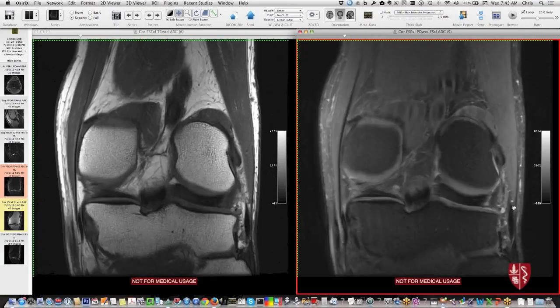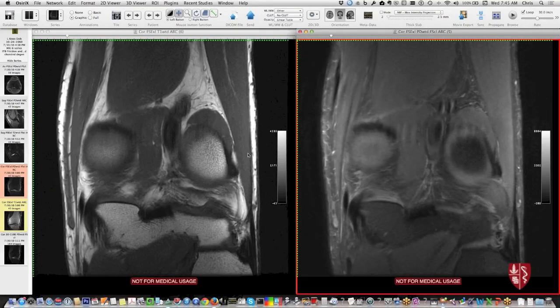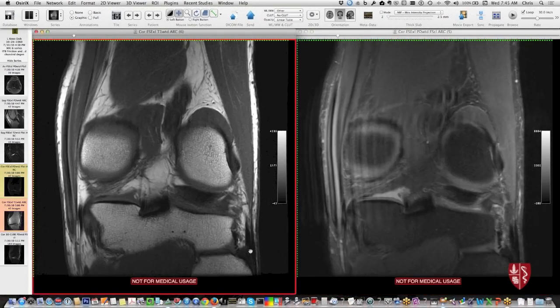Then the other lateral thing, posteriorly, is the biceps femoris muscle and tendon coming down, and that has this conjoint tendon coming down to the fibula with the fibular collateral ligament. Okay, so those are posterior structures in terms of their distal part.